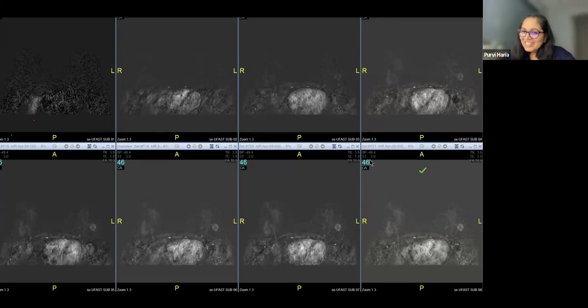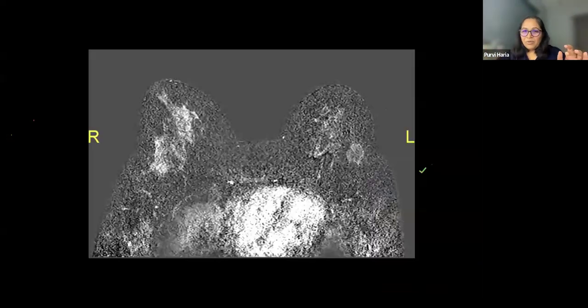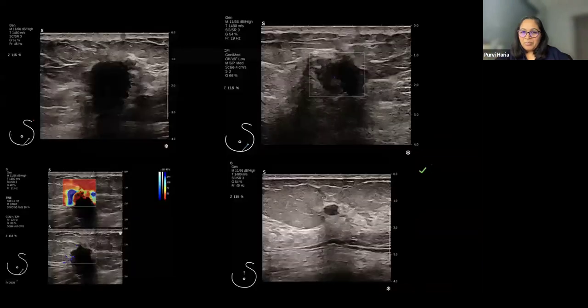Yeah, that is perfect. This is the same image that I took again, to see how it looks with the mammogram and ultrasound pictures, and when we compile everything together, how we reach the final assessment. So this lesion is showing enhancement and it is seen very nicely. Now, that 12 o'clock lesion, which was there in the breast on ultrasound, did not show any enhancement.